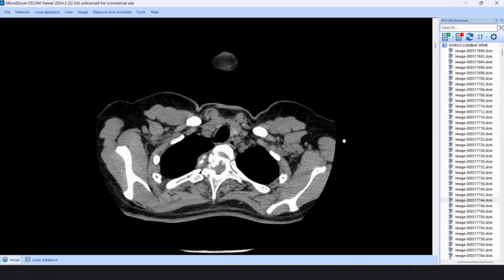Very good. I think the lytic lesion is centered upon the right pedicle, and extending to the vertebral body and spinous process. So the most logical thinking is that we have a metastatic lesion. The other differential diagnoses may be myeloma, maybe lymphoma, maybe other infiltrative lesions, or a primary osseous lesion. But I think this is the most logical thinking. So we did a metastatic workup for the patient.